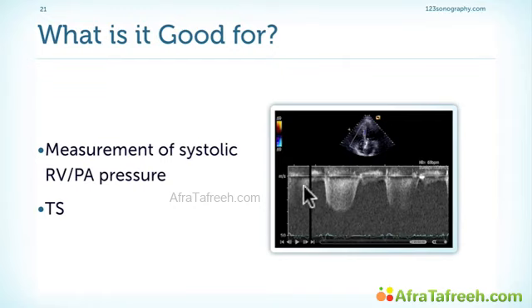So this is a signal that you will need very often because very many patients have at least mild or moderate tricuspid regurgitation, and that helps you to assess pulmonary pressure. Other than that, you can use the continuous wave Doppler across the tricuspid valve for forward flow if you have the suspicion of tricuspid stenosis and if the velocities are very high, but usually it would be sufficient to use pulsed wave Doppler across the tricuspid valve, even in the setting of tricuspid stenosis.